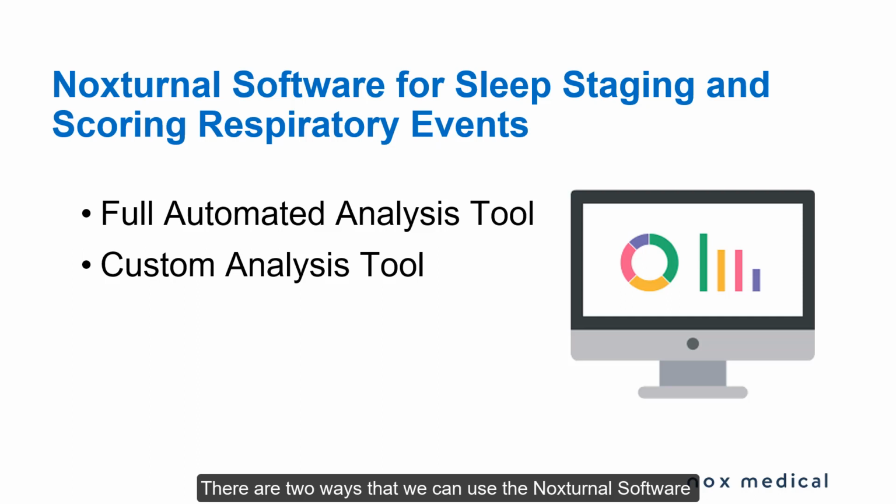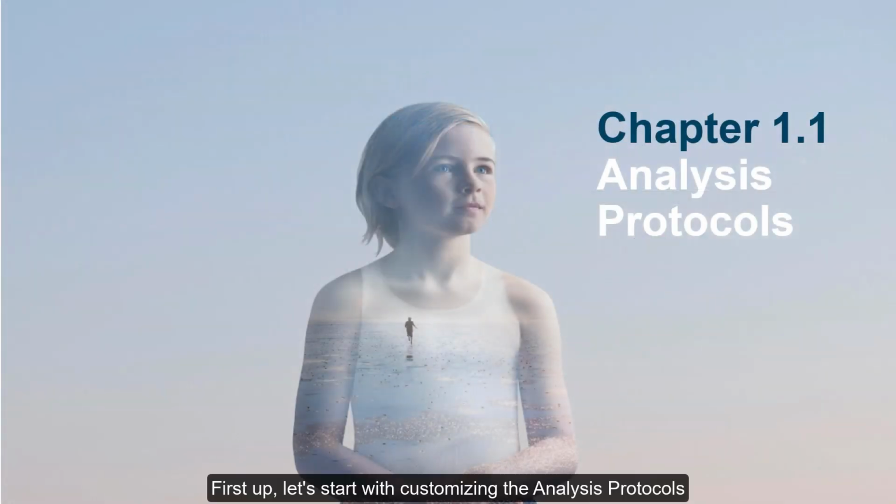There are 2 ways that we can use the Noxturnal software for sleep staging and scoring respiratory events. The first method will be the fully automated analysis tool, and the second method will be using the custom analysis tool. First up, let's start with customizing the analysis protocols.